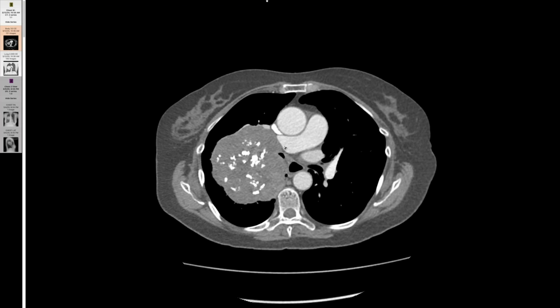Okay, so we have consensus. It turns out to be the world's largest hamartoma. So it's a completely benign appearing hamartoma. It'd be fine for a hamartoma except for the size, and it must have just been very slowly growing, as hamartomas do, and so it got to be huge because it was so well tolerated until the end here.